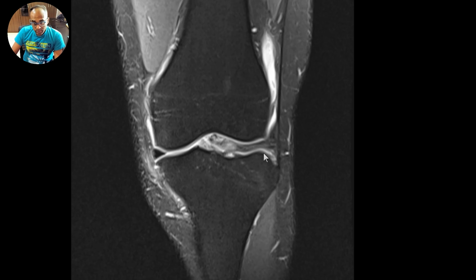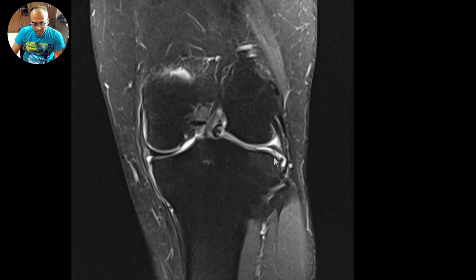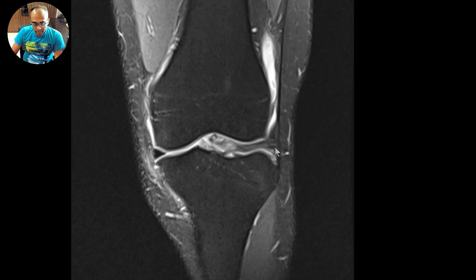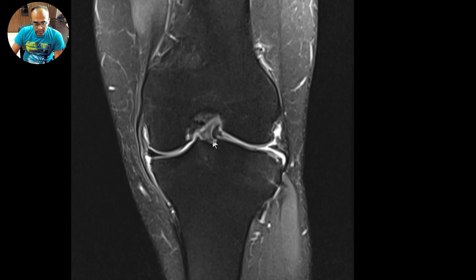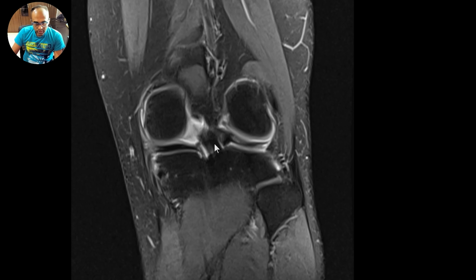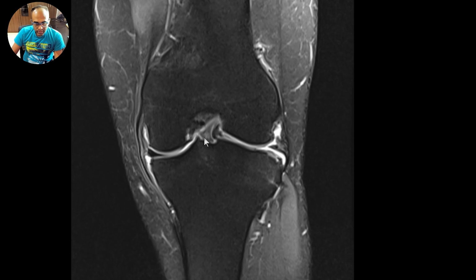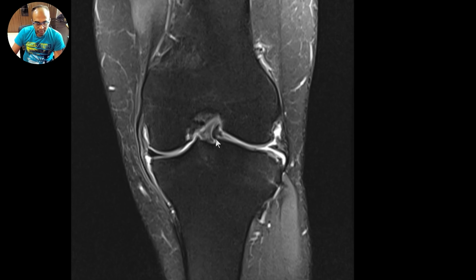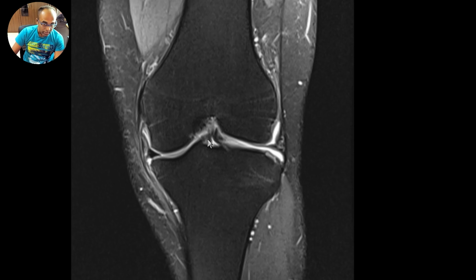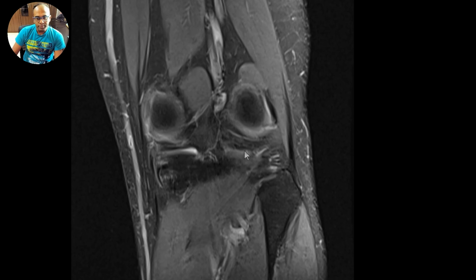And when I come to the lateral meniscus, I can see that the volume of the anterior and posterior horn is definitely reduced. And look at the intercondylar region. You can see here you have the PCL going across, and here you have the ACL. So the ACL, the PCL, and there is a third fragment over here. So clearly it's a flipped meniscus. The meniscus has flipped into the intercondylar region. It is a bucket handle tear of the lateral meniscus.